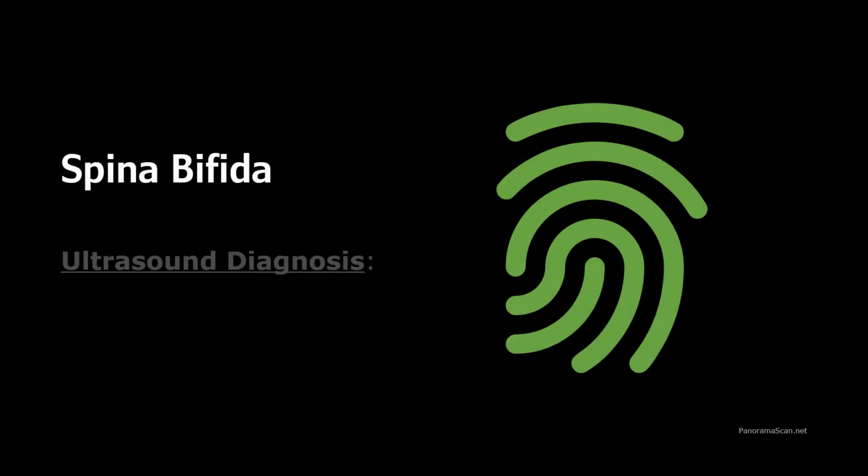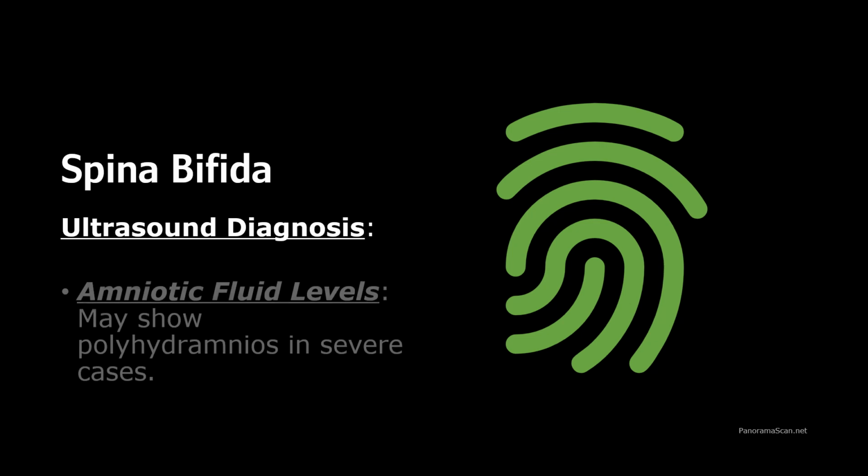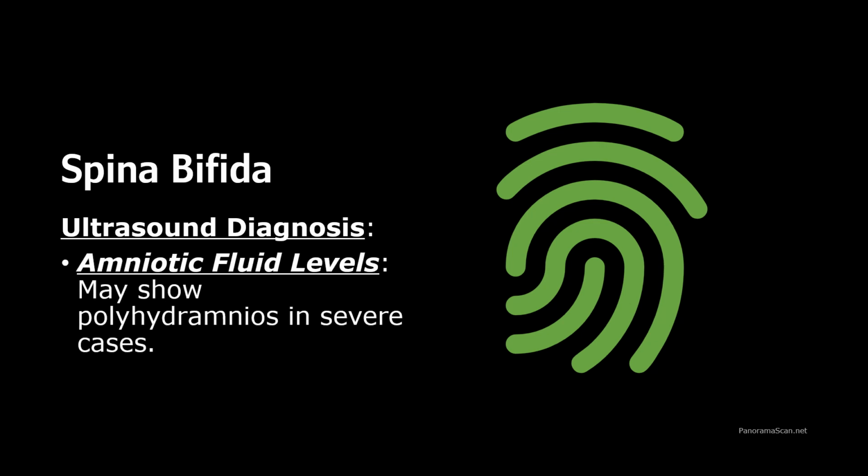In severe cases of spina bifida, you may observe polyhydramnios, or an excess of amniotic fluid. This occurs due to cerebrospinal fluid leak from the spine into the amniotic cavity, and impaired swallowing functions of the fetus, which can result from neural tube defects like myelomeningocele. The presence of polyhydramnios may indicate associated gastrointestinal or other neurological issues that hinder normal fluid consumption and processing.